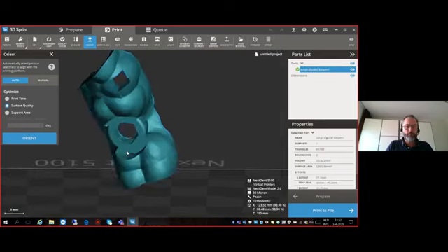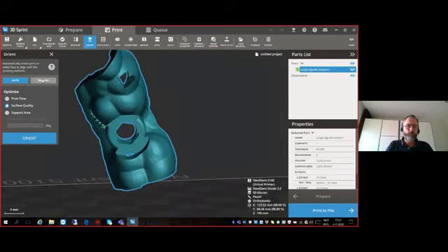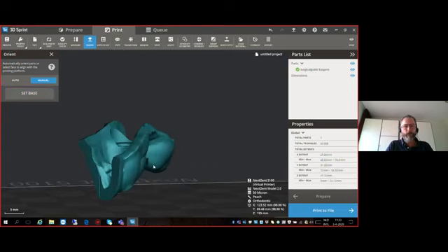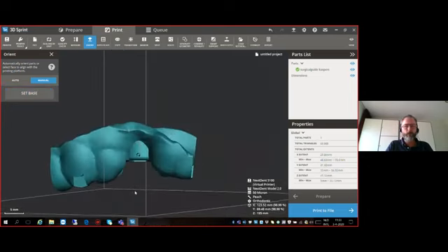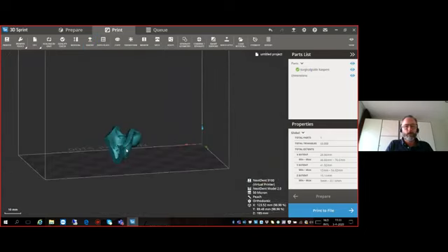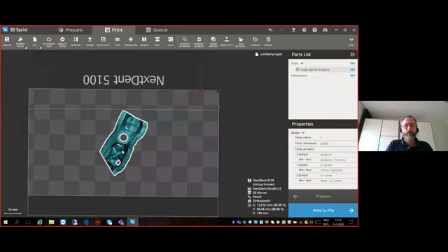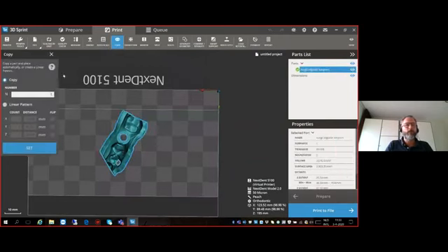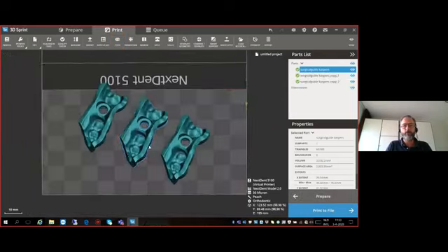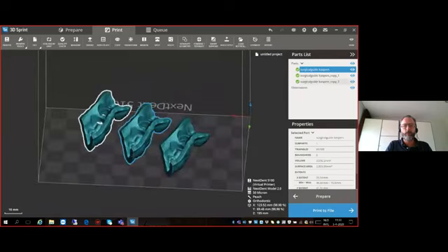Make use of orient. Select manual. Click it, and now you can see that the hole is, let's say, perpendicular to the platform. For whatever reason you want more than one, you can just select it, click set, and you see that automatically it will place 2 extra surgical guides on the platform.